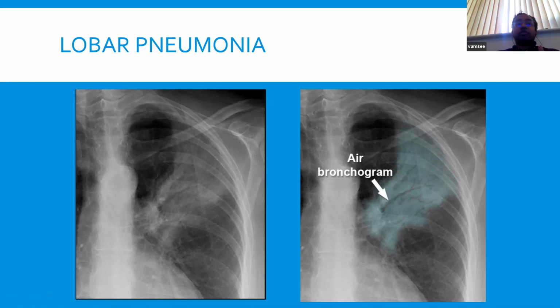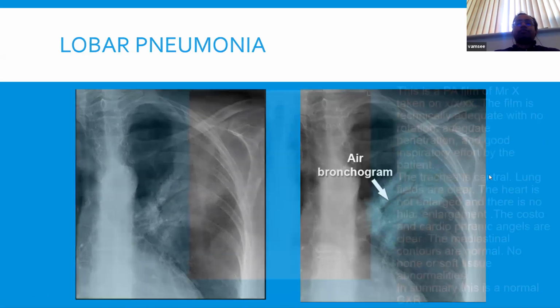In this case, you're thinking of a pneumonia. What's there? Probably a combination of pus, white cells flooding to the area, bacteria, necrotic tissue, edema, inflammatory changes, a whole host of things. But what that results in is gunk surrounding the airways, which is why you see this very nice clear pattern. You could almost with a pencil go and draw out the different airways extending far beyond the hilar. So that's what's known as an air bronchogram, and that's a pathognomonic sign for a lobar pneumonia, or at least pneumonia consolidation, rather, in that particular zone.